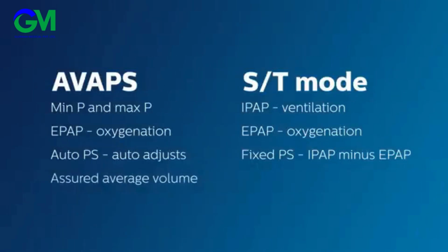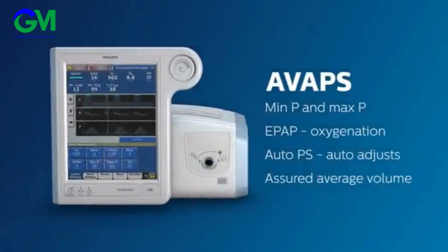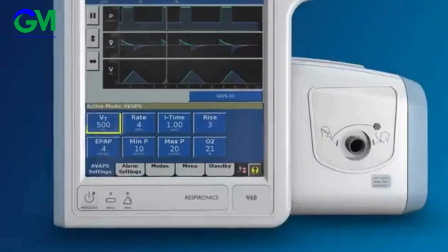It does this based off a new setting added, tidal volume. In other words, the IPAP will adjust within the set range of pressure in order to deliver the desired, targeted tidal volume. On the Philips Respironics V60, you may notice there is no longer an IPAP setting here. Instead, the IPAP has been replaced with a targeted tidal volume setting.